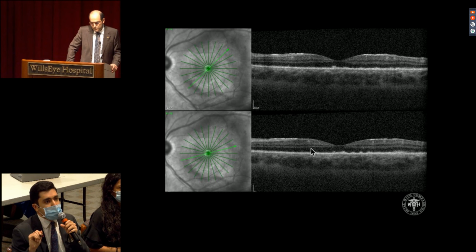So the inner retina appears grossly normal here, and looking at the outer retinal layers, the RPE layer itself is preserved, though it does seem to have this lumpy nodular appearance, especially centrally, with these clumps or clusters that we're seeing here, very distinct foci. And then looking at the ellipsoid zone itself, it appears to be completely gone in the central aspect and just preserved here in the very temporal part of it, which I guess is a little supratemporal.